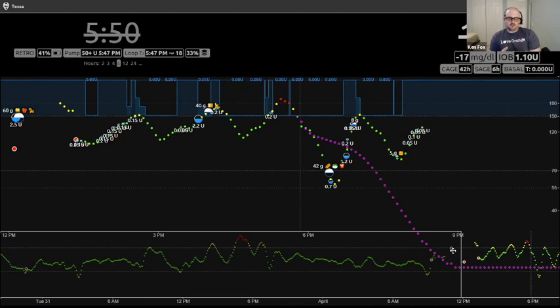You don't have this option in the Loop app. You can go backwards every 5 minutes and see what Loop's prediction was and see how it changes as things move, and then start to see what pieces might be affecting that. That's definitely unique to Nightscout, and probably one of the main reasons why I would encourage someone who is just looping themselves and not necessarily caring for someone else to have a Nightscout site, just so you can go back and try to understand what's happening and why.